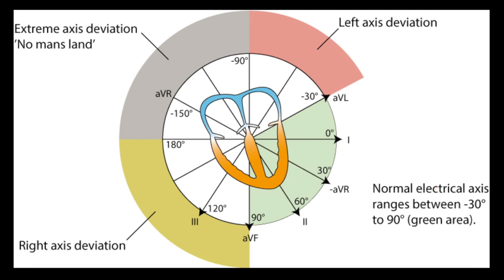So you have electrical energy that goes through your heart, and it normally starts up here somewhere in the top on our projection here on the top left, and goes across the heart and then down towards the bottom right. The axis is the main direction of the electricity that flows through your heart, and it generally goes, at least looking at it, from our top left to the bottom right, or from the patient's right, essentially right arm, down towards their left leg, or the left side of their chest, left side of their upper abdomen, something like that.